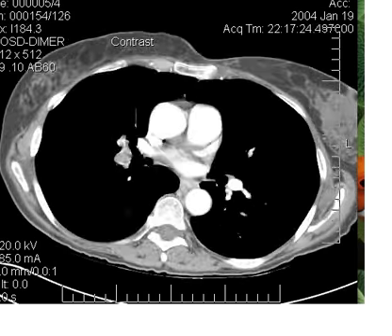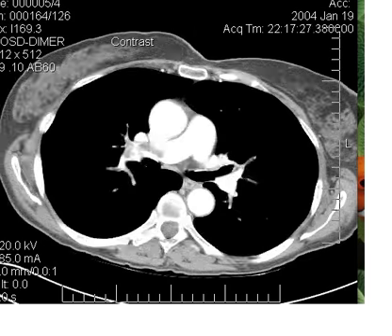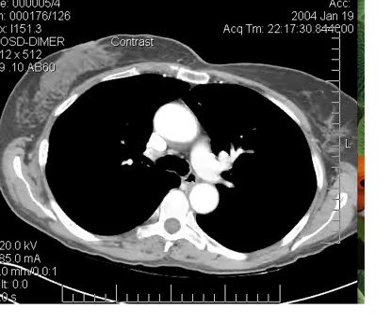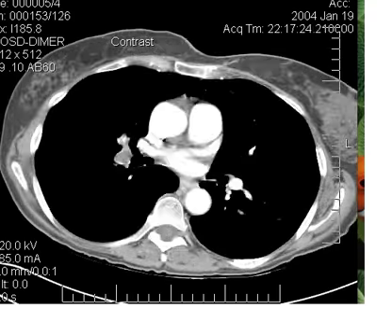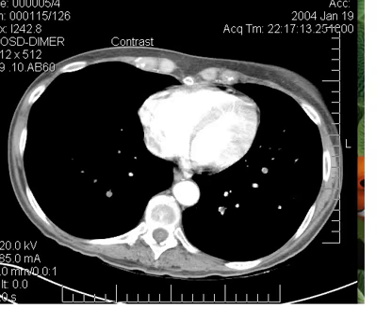that in turn branches just below the aortic arch. Ascending aorta, descending aorta. Go up a little higher, we're at the arch. Arch and down, look for the branch: main pulmonary artery, right main pulmonary artery with clot, left main pulmonary artery. Okay, that's it.